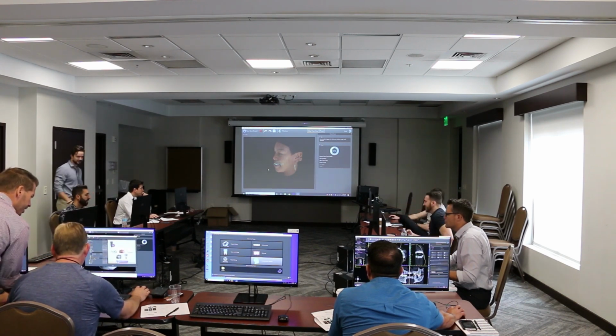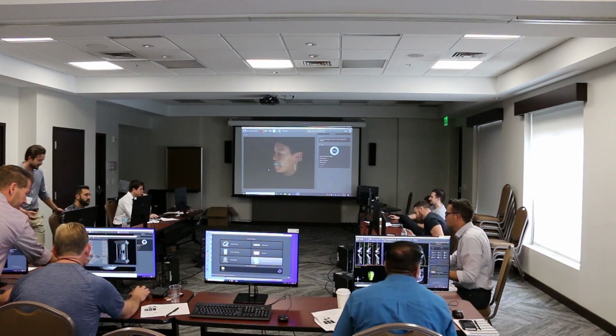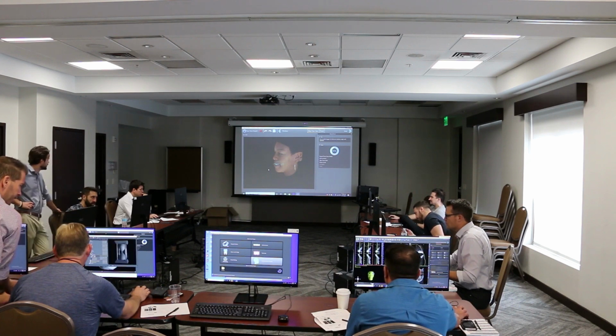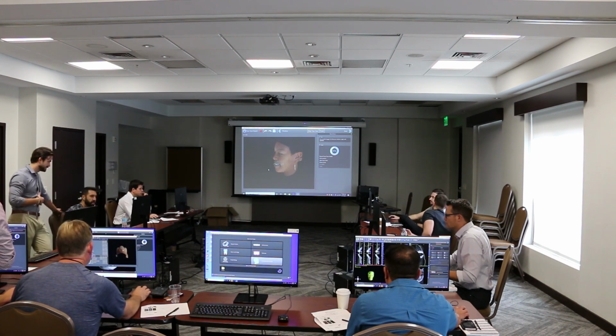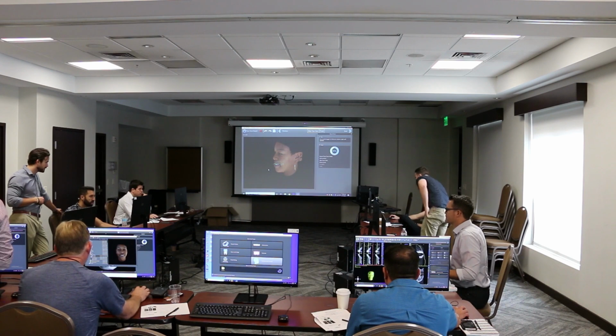Yeah, for sure. It's really nice, the software walks you through most of these things. Yeah, and it should be colored now on the right. There you go. Everything kind of lines up. So let's do the seal. That's just to give us a rough seal of the scan.